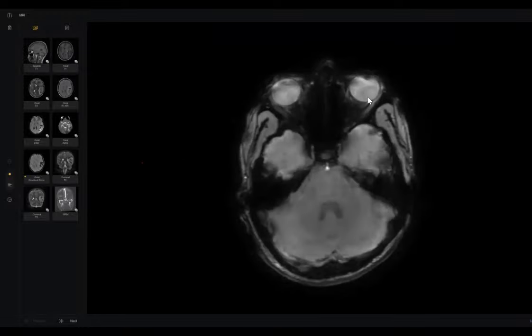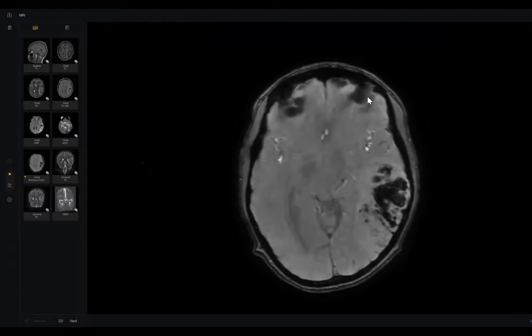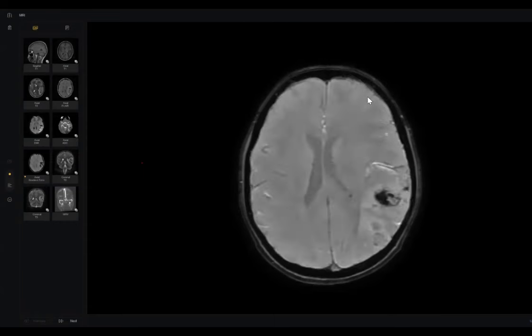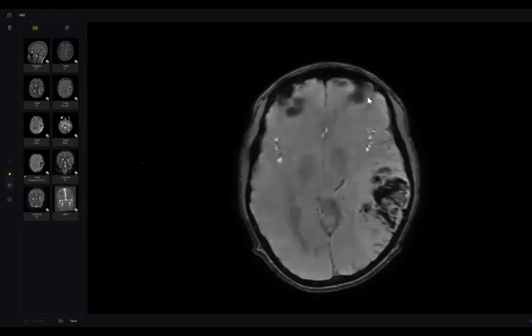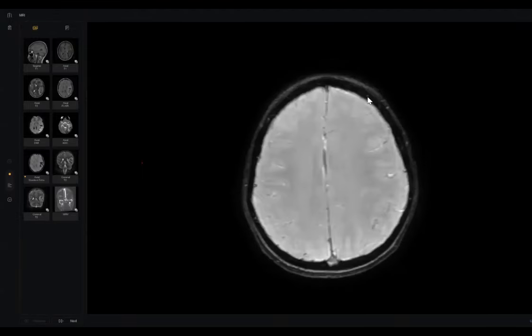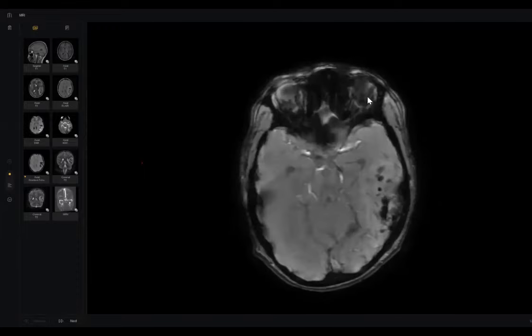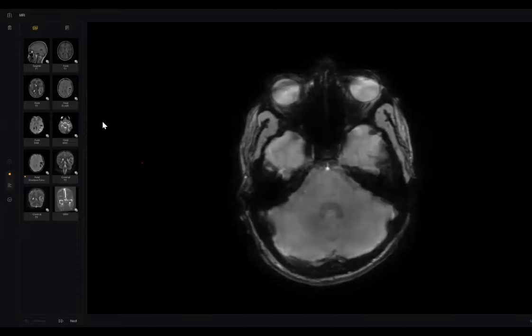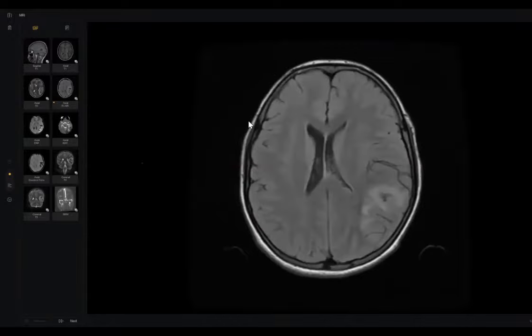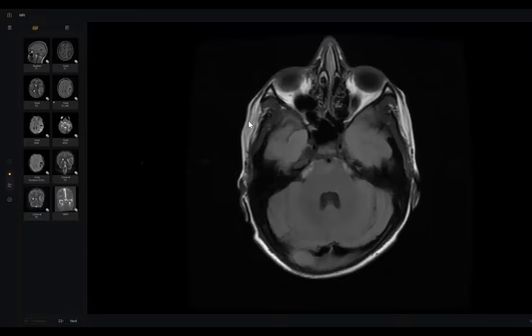I will help you, but give me a differential diagnosis before helping you. This is SWI, right? I can see areas of blooming artifact as well, so this is hemorrhage. But hemorrhage could be either a primary parenchymal hemorrhage, or hemorrhage in a pre-existing lesion. So what's your differential diagnosis?